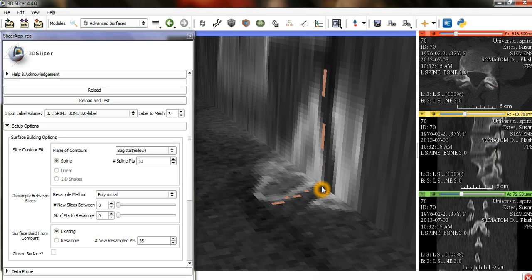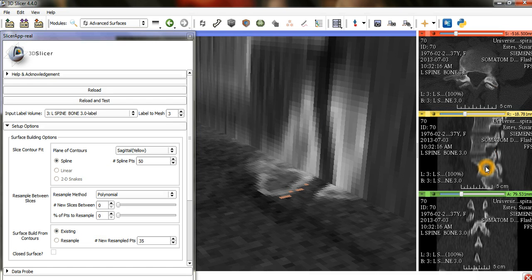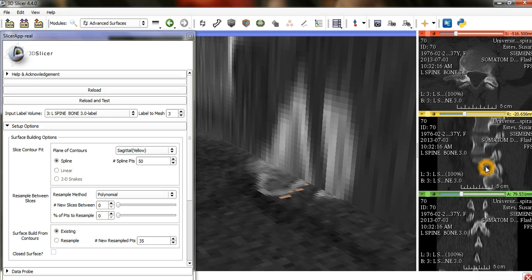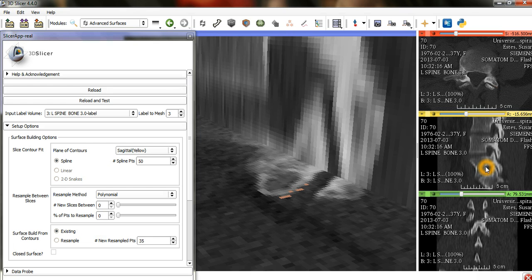So the last time we talked, you had kind of wanted me to isolate just the surface based on the parasagittal and then the axial cuts here. And what you're seeing here is one of those sections. You kind of see the right angle. And so we're kind of segmenting along this face. And so I've already done it. And like I said before, it's a bit of the software. I've already labeled a lot of these points. And so I'm going to save you the time here, and I'm just going to go through it.